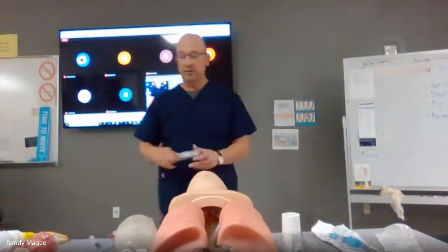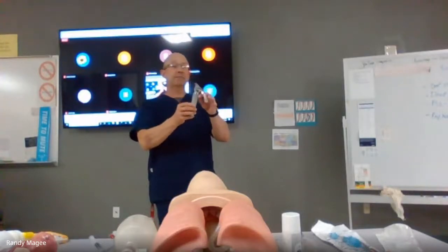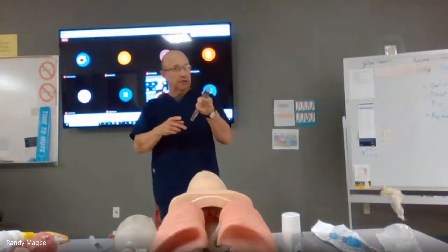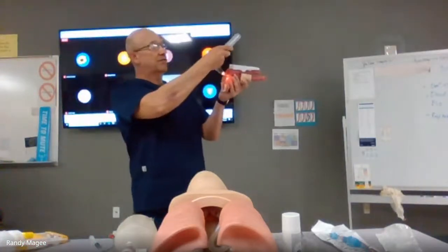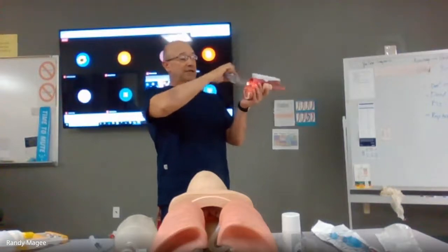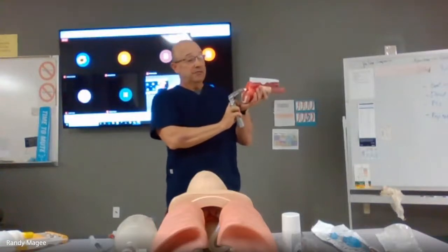Okay, and the last thing as far as equipment, you have the laryngoscope. You have my favorite, the curved blade, the Macintosh blade, and there are different sizes for different people. This happens to be a 3, so it's the common one. The curved blade, I use it because it requires less forearm strength. And the way the curved blade works is it goes into the vallecula. That's the space behind the epiglottis and the tongue, at the base of the tongue. So it indirectly lifts the epiglottis because it's in that vallecula.